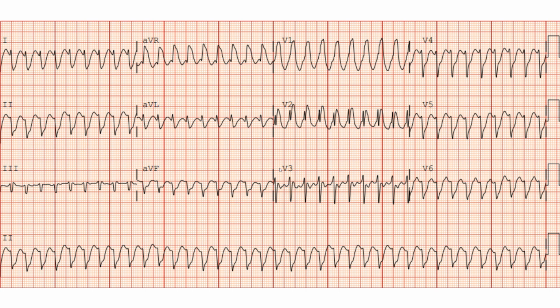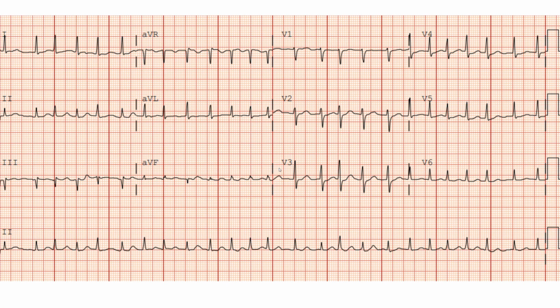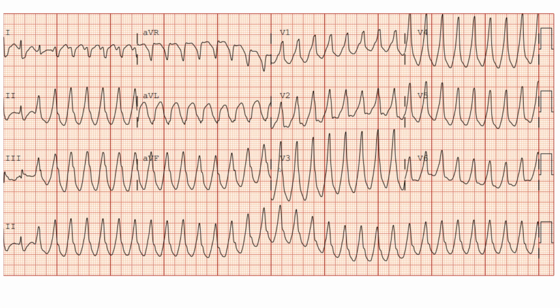Okay, they started him on amiodarone and they put in an AICD, which I agree with, right? Because whether it's VTAC or whether it's aberrancy, this gentleman had an unstable wide complex tachycardia. And the best treatment for that is electricity and medications, which they put him on. Same thing for this gentleman. They took him to the electrophysiology lab and found inducible ventricular tachycardia, and they put an AICD in him and put him on antiarrhythmics as well.